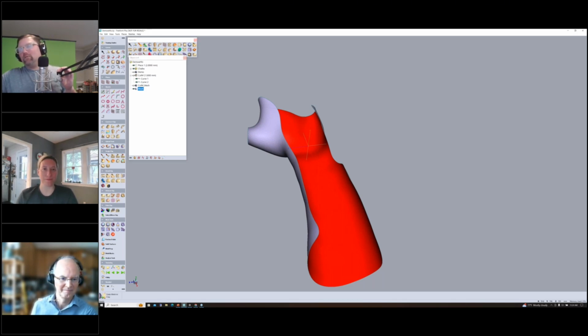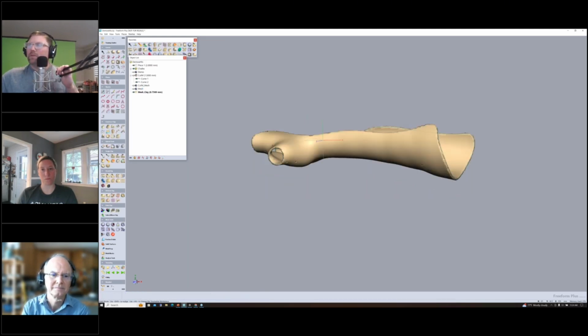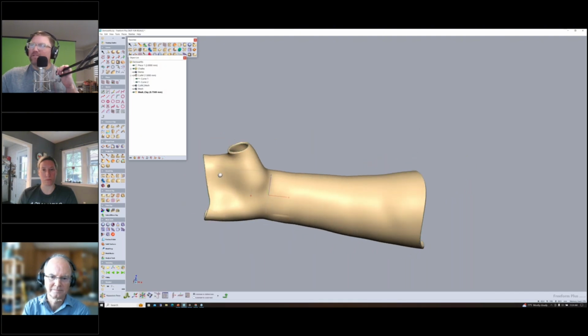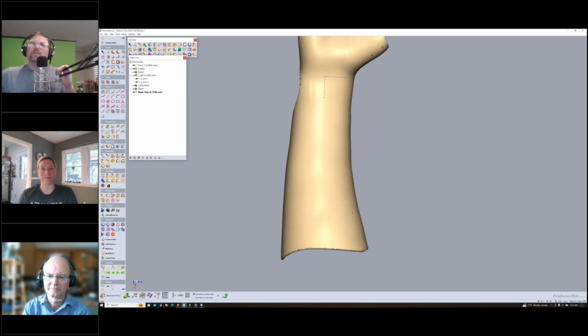Depending on what my last setting was there, I'm going to double the clay coarseness, and we're also going to thicken this. We're going to thicken it to the outside, and we're going to go 2.5 millimeters, which is the typical wall thickness for powder bed fusion. So not really super amazing looking, like the edges look a little bit raggedy and that sort of thing. I don't care right now. I'm just trying to get something quick, and then you'll see the magic.